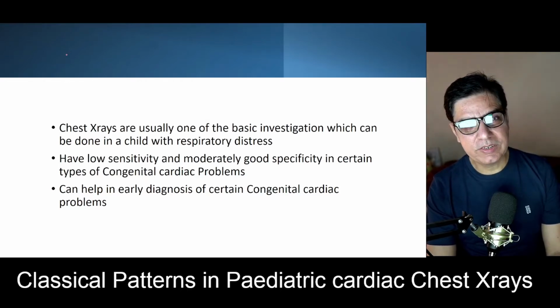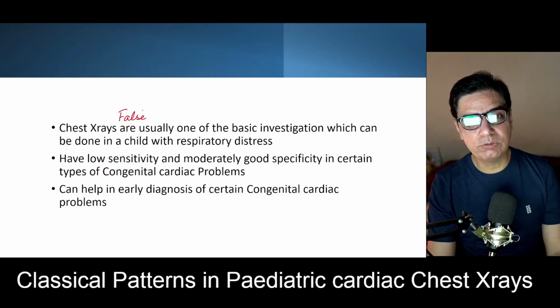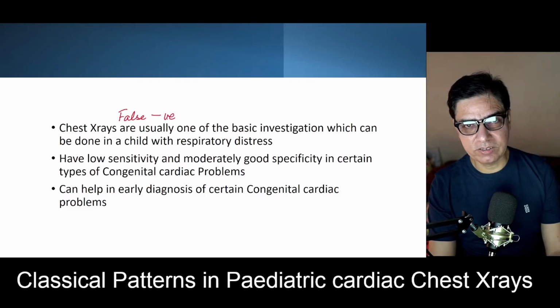Low sensitivity means that they can have a lot of false negatives. In other words, if a child has congenital heart problems and you do a chest X-ray, many times there would be nothing on the X-ray, though the child has a congenital heart problem. We call it a false negative. So there are many false negatives with chest X-rays. So it has low sensitivity.